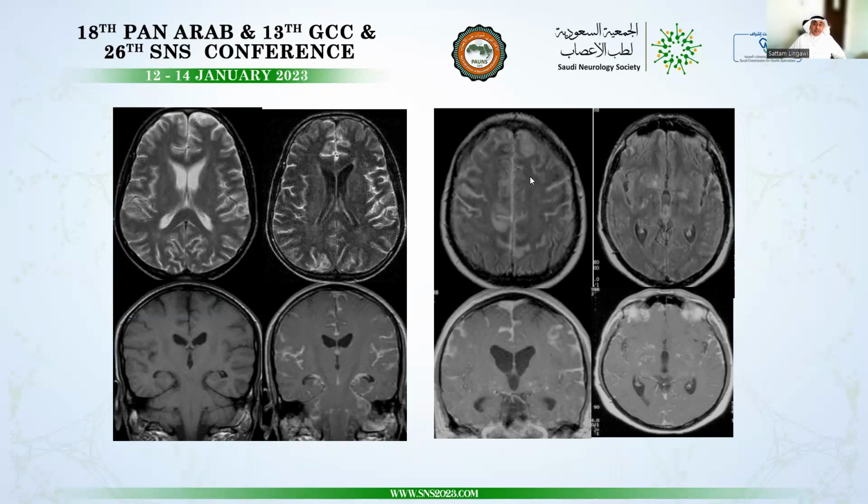Now, other possibilities that may simulate this appearance, although not classic, are hyperventilated patients in the ICU because of high oxygen tension within the cerebral CSF, and the possibility of having a cerebral infarction or a tumor with leaking of protein content into the overlying sulci, but that will give you localized areas of CSF high signal intensity, not as diffuse as it is seen in these cases.